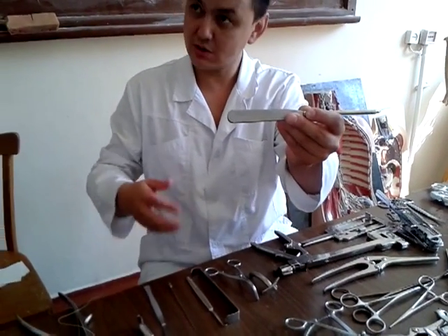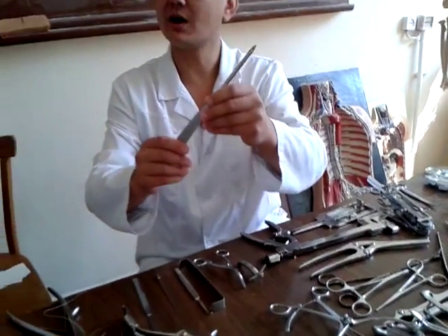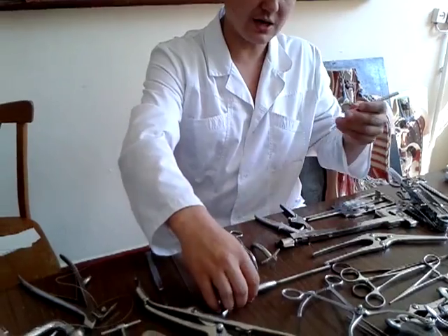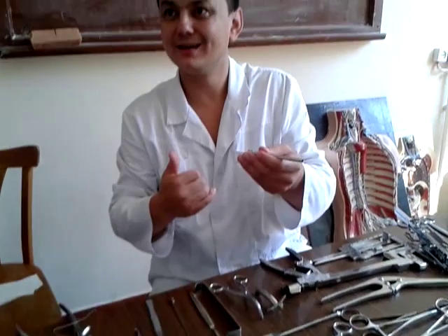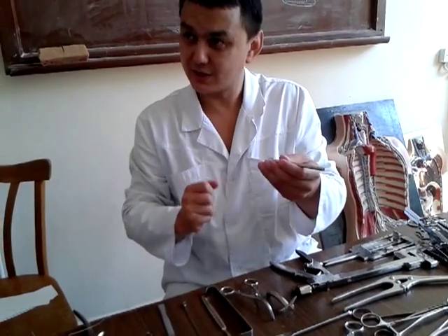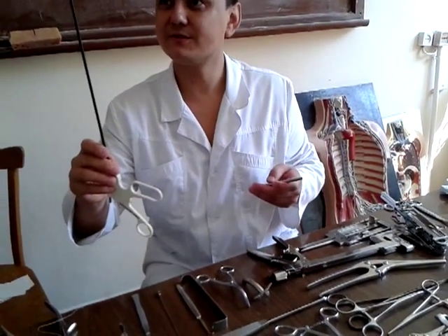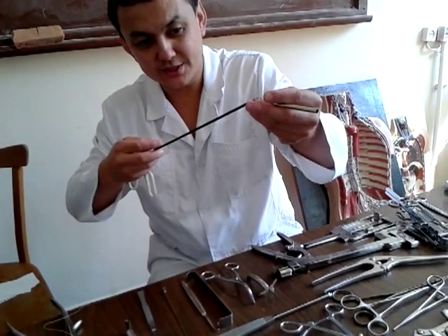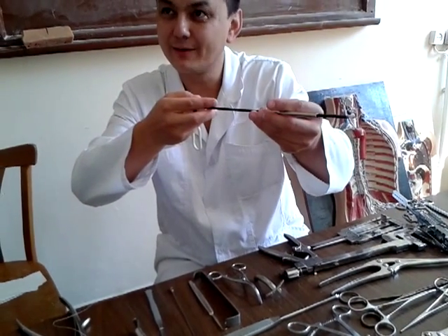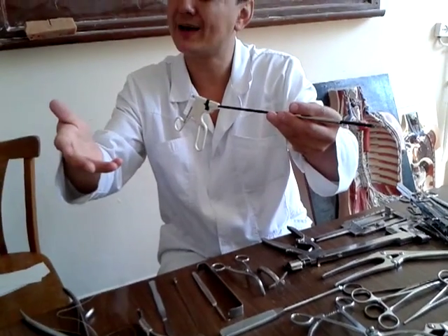Thoracocentesis, laparocentesis, when we use the trocar. With the trocar, not only can we remove fluid, pus or blood from the thoracic cavity, we can also use instruments for endoscopy. Through this tube we can put instruments in and perform laparoscopic or endoscopic operations.